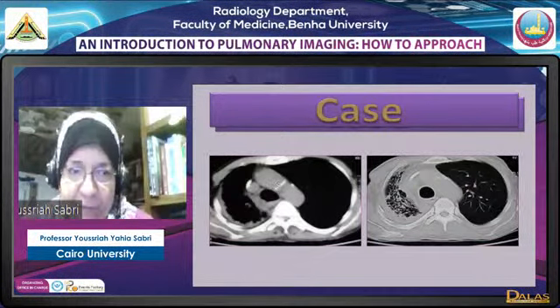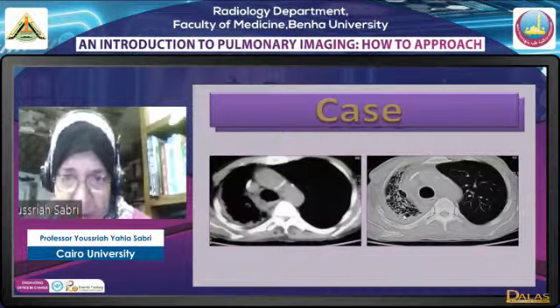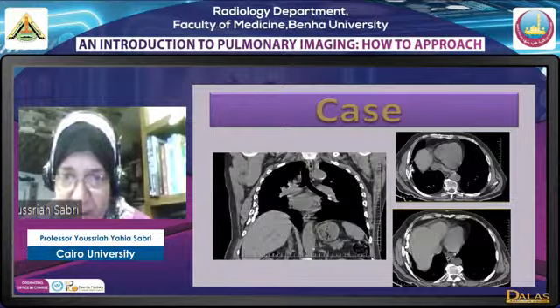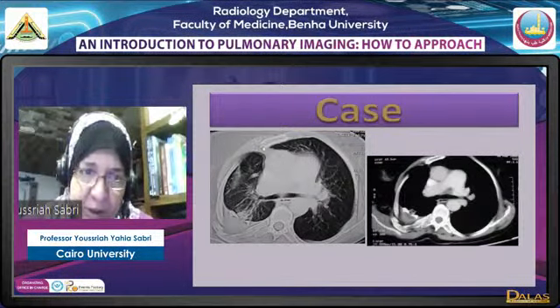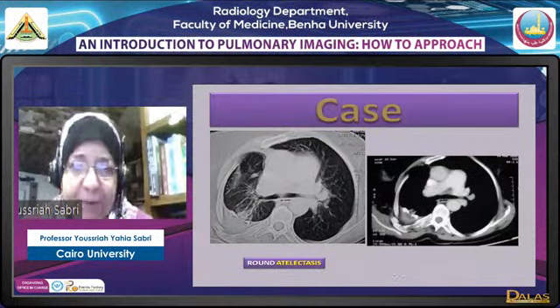Now we have pleural thickening and fibrosis of the lung, decreased volume. This is a case of fibrothorax and cicatricial collapse of the lung. This is a case of localized thickening of the pleura, fibrothorax that is localized with intense calcification, with decreased volume of the hemithorax, right lung. Another case with fibrosis, decreased volume, and calcification. And as I said, we have seen this before. This is round atelectasis.